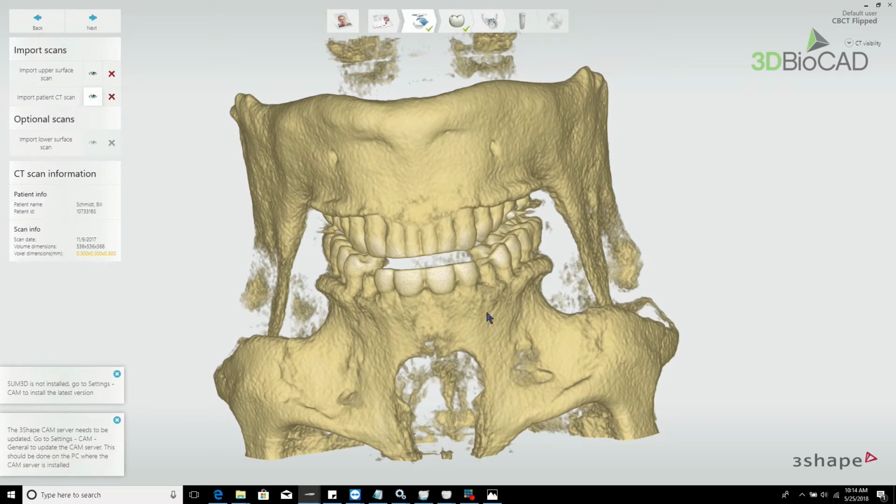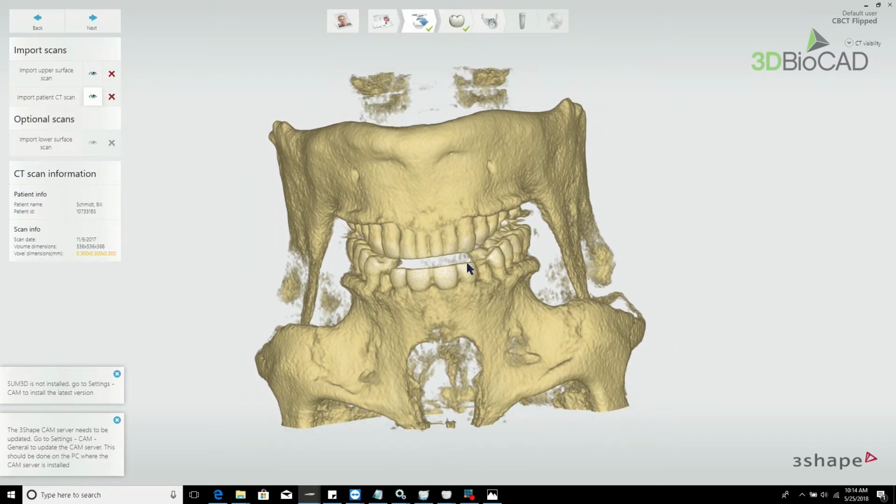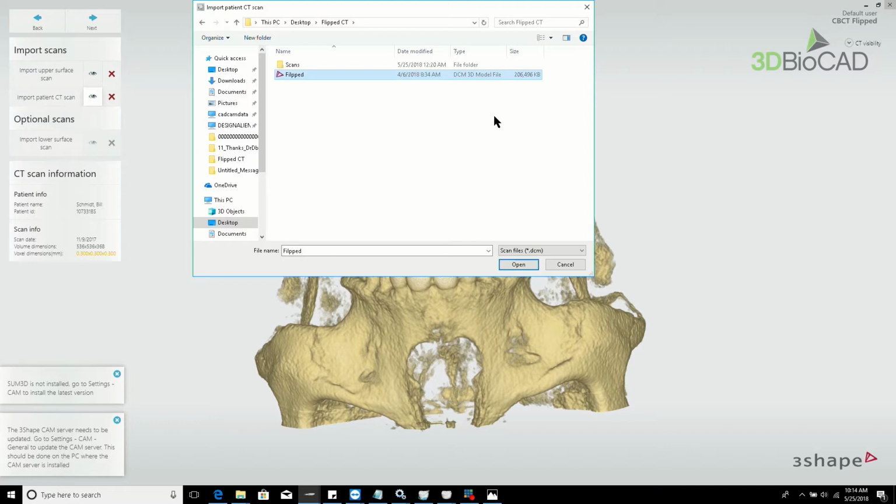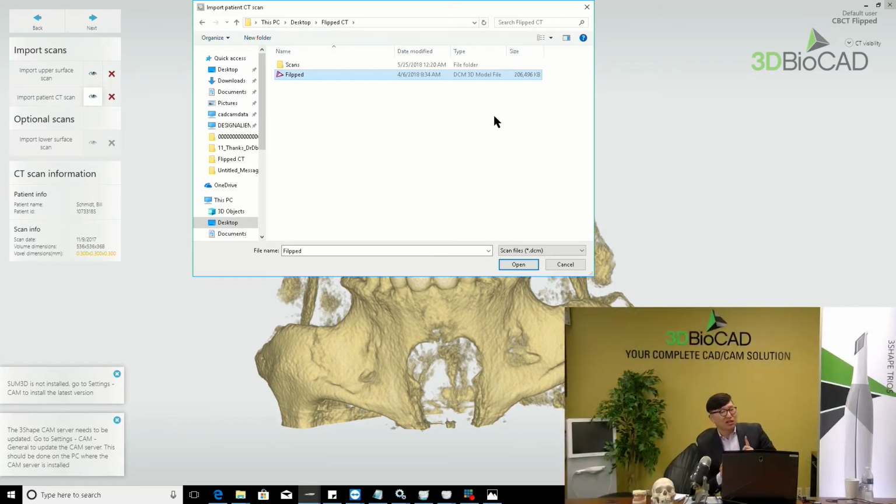When I imported, the doctor gave me the CBCT, but that DICOM was one single huge DICOM file. The CBCT machine can export in several different ways. There's multi-slice DICOMs, and there's also a one big single DICOM file option. So please ask your doctor to export multi-slice, mostly about 300 or 400 slices. That DICOM export is what we want to have.